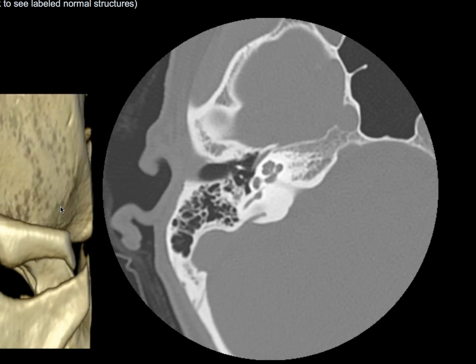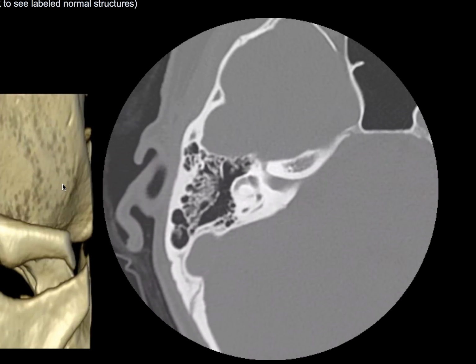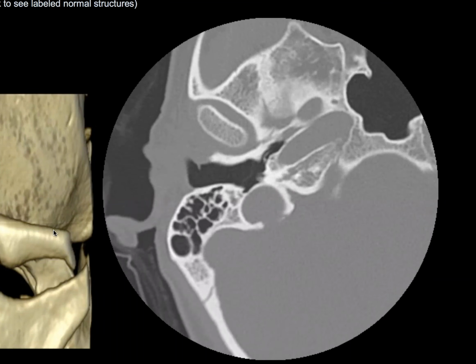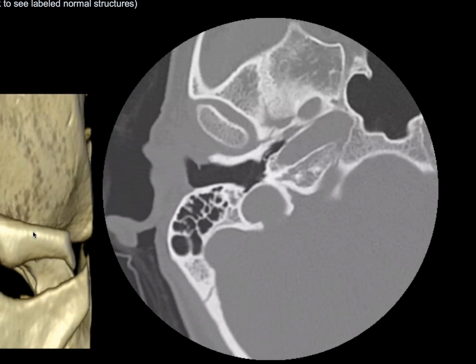You can see that the stapes is really small, but you can see the anterior and the posterior crura attaching to the oval window, right there. Always remember that the middle ear connects to the mastoid cells through this door, that's the aditus ad antrum, and the mastoid cells, this big portion of air, is the antrum itself. Going down, nothing important anymore, and the external ear that has its cartilaginous and these bony parts. That's it, guys. Super easy.